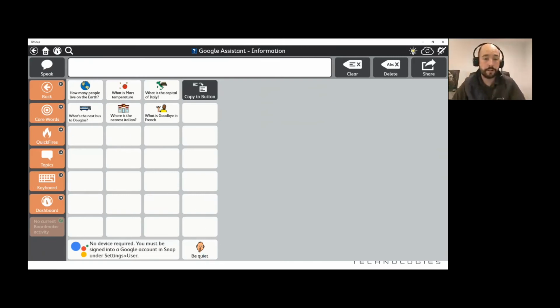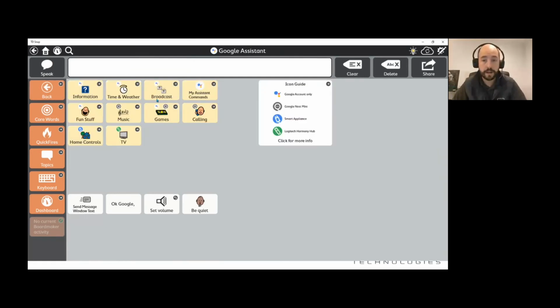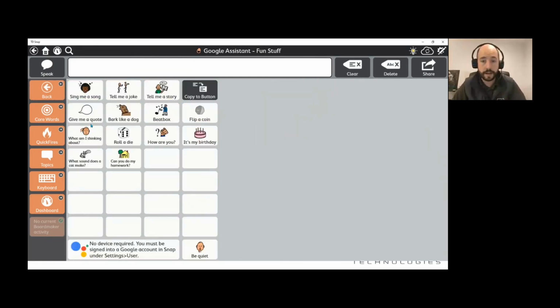So you can see that you can use that for information, but I can also, if I press back, go to fun stuff, for example, and ask her to tell me a joke. Tell me a joke.